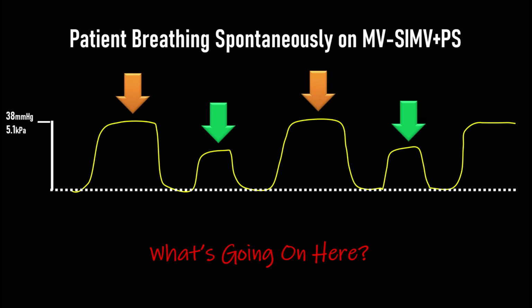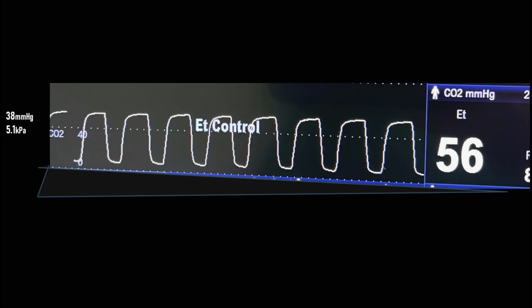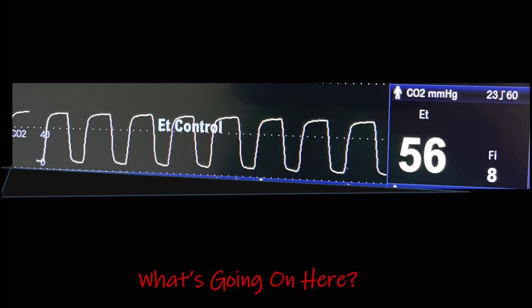You give the patient some more muscle relaxants because the operation is going to go on for a couple more hours. And then you notice this particular trace. Now, what I want to draw your attention to is two things. First of all, clearly the end tidal CO2 is very high, it's 56. But there is another problem here, and that is this. The inspired CO2 is 8 millimeters of mercury.